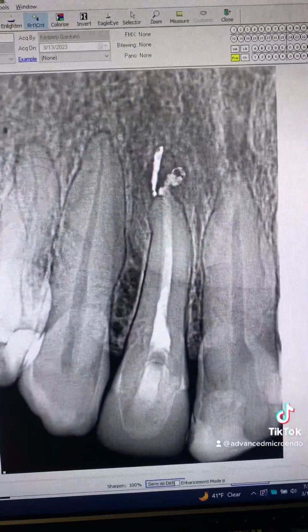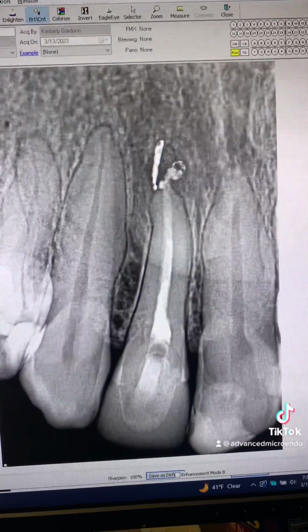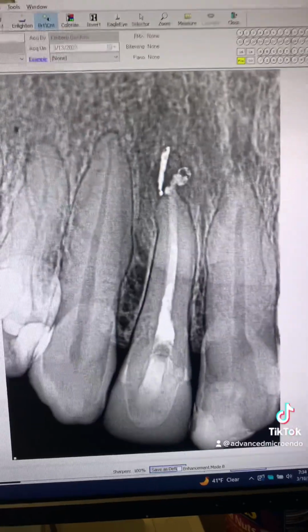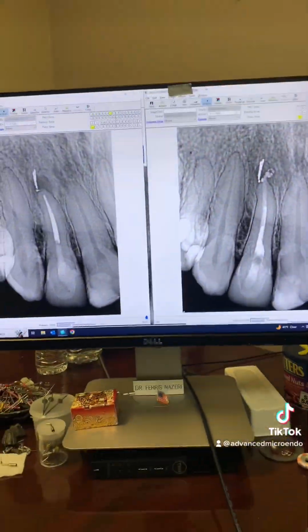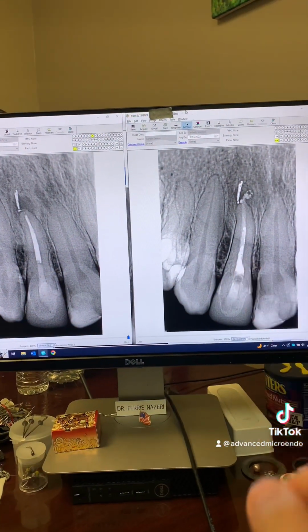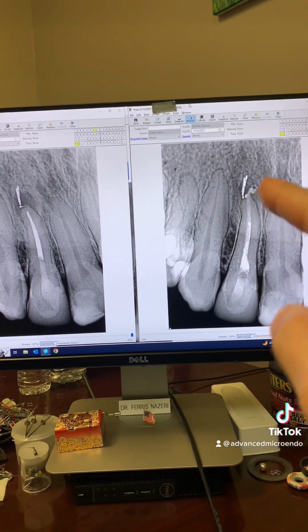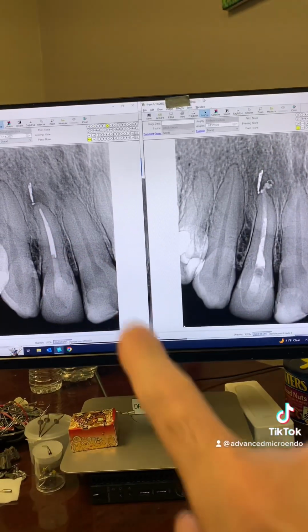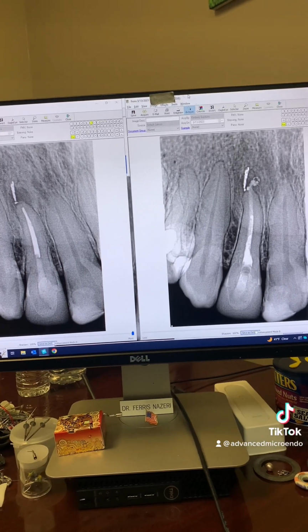And this was just a couple of days ago. And take a look. This is 2 months post-op of the tooth, and the periapical radiolucency is so much smaller already. That's the date, as you can see. Zooming out so you can see the difference. 2 months ago, just a couple of days ago. 2 months, and already there's so much bone deposition, so much healing as compared to 2 months ago. Excellent. I'm very optimistic about this tooth. We avoided a surgical treatment.